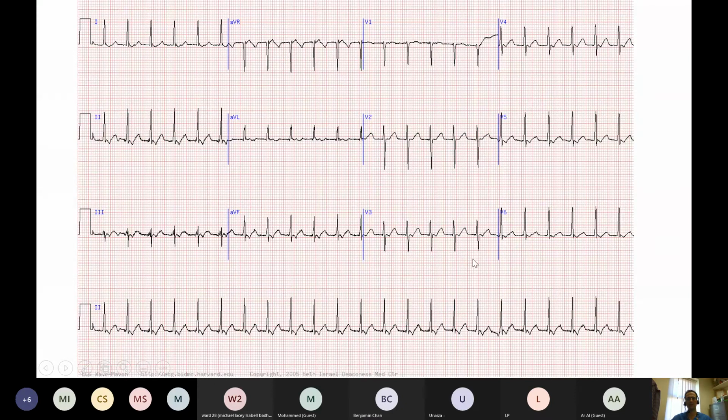So sinus tachycardia is a common cause of a narrow complex tachycardia, and usually it becomes very obvious if you monitor the patient because the rate increases and slows down, and P waves can become visible or merge with the T wave if you have first degree heart block. So it's conceivable that there is first degree heart block and our P wave is buried in the T wave, but the absence of any sign of a P wave makes this unlikely to be a sinus tachycardia.